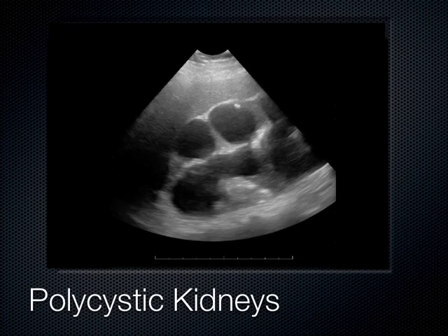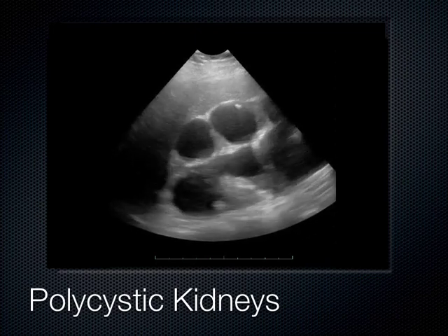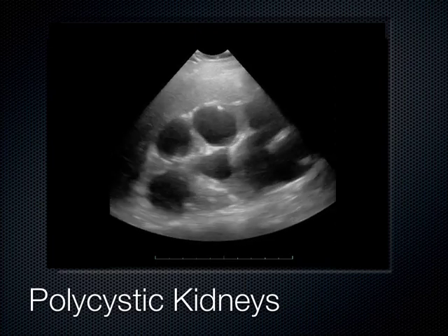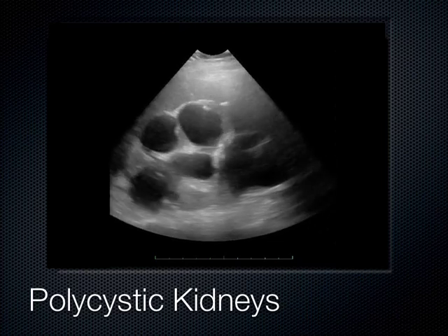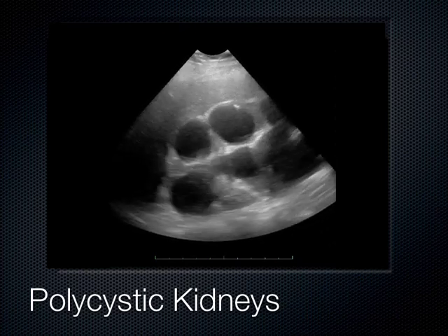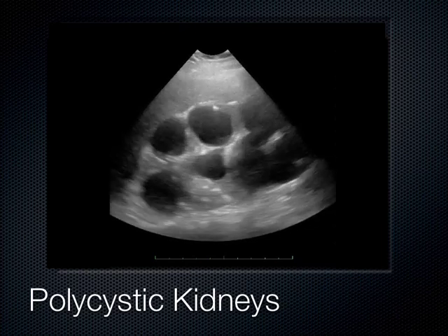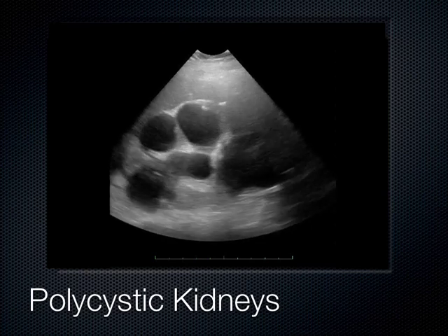You've heard of polycystic kidney disease? This is what it looks like on ultrasound. These are all these cysts seen out here in the cortex. We can make out that one here, this one here, this one here, this one down here. Polycystic kidneys, and it's bilateral. And you can see it also affects other organs. Sometimes you can see cysts in the spleen. You see them around the liver. Ovaries look like this when they have polycystic disease.